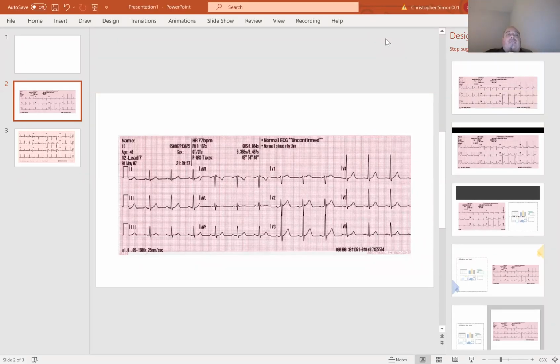Okay, so let's just look at a 12 lead real quick. This is going to be a quick video. We're just trying to identify what we're looking at here. We're not going into anything crazy, just so you can at least make sense of what you're looking at. So let me get my pen out here.